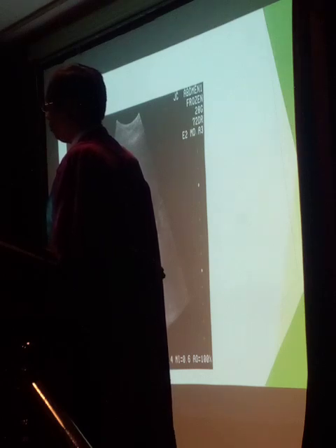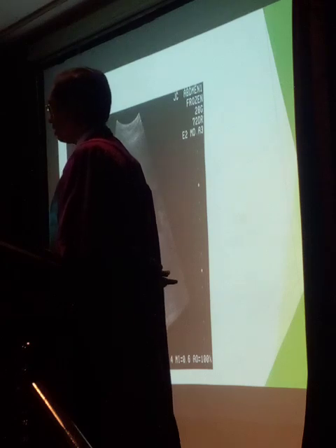Those are actually metastases which come from a pancreatic primary. When we see hypoechoic, black dots in the liver, we have a few primary sites to look at.